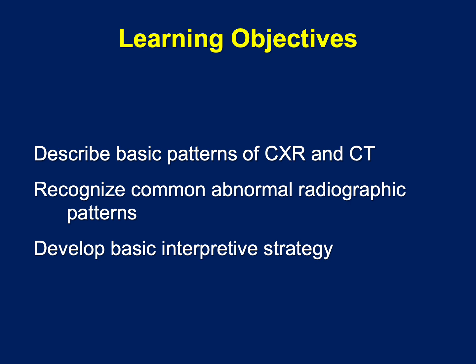Our learning objectives for today are to describe the basic patterns of chest X-ray and CT, and to recognize common abnormal radiographic patterns. We will try and develop a basic interpretive strategy.